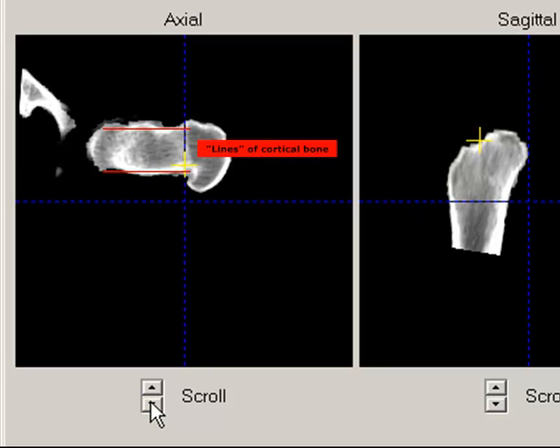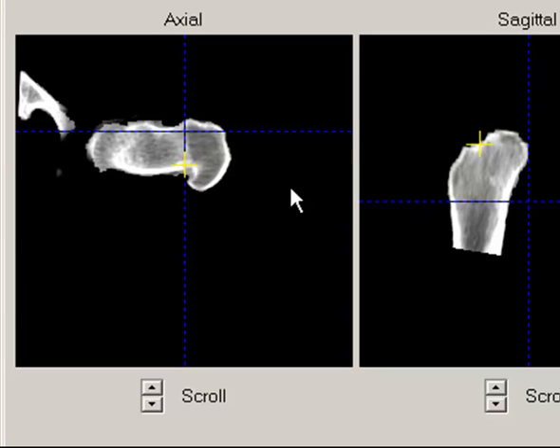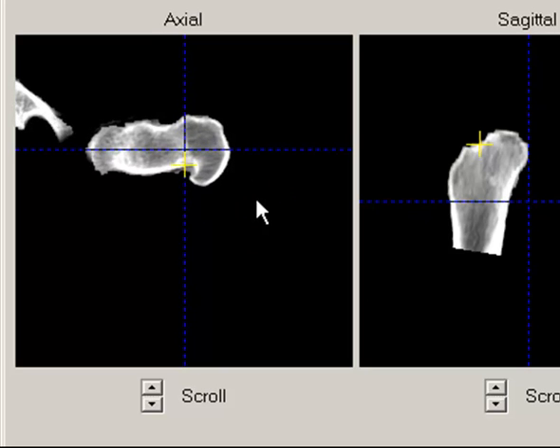If the two lines of anterior and posterior cortical bone in the neck are straight and parallel, rotate the neck until these lines are parallel to the horizontal reference line. If the two lines of cortical bone are not parallel, drag the reference line to the middle of the trochanters, split the difference between the anterior and posterior neck, and rotate the neck until it is as horizontal as possible.